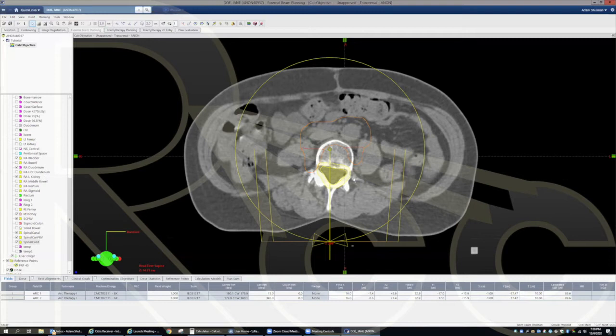Maybe there's high risk volume near the right parotid, and the doctor asked to spare the left parotid as much as possible, allowing you to sacrifice PTV but cover CTV. These are the sorts of discussions and questions that I would ask the doctor beforehand. And same with this overlap of PRV and PTV-45. Good question, Claire.